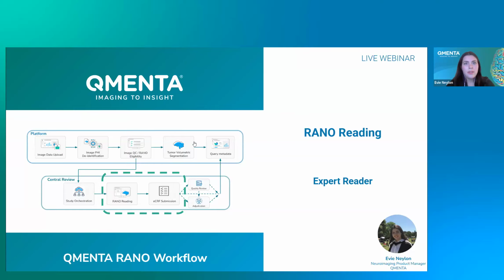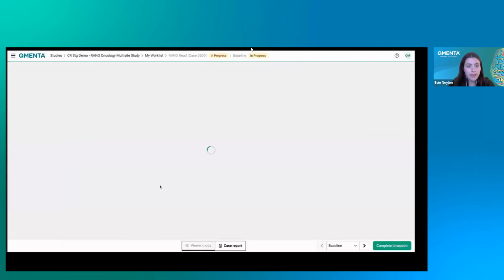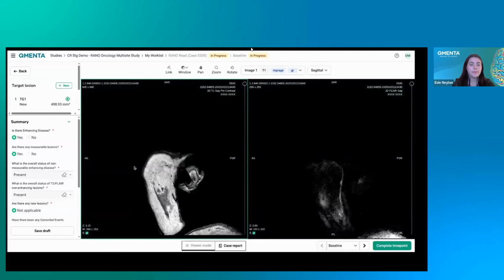Thanks. So let's see what life is like for our expert reader using our central review module, and I'll be playing the role of reader today. The reader's user interface is comparatively minimal. I have my work list where I can see that I've been assigned a RANO read case for 0500 and no other distractions. So when I access this read, I find myself within a longitudinal task environment.